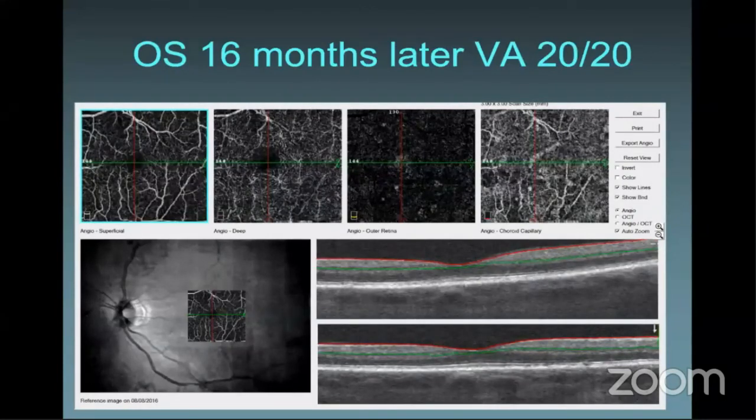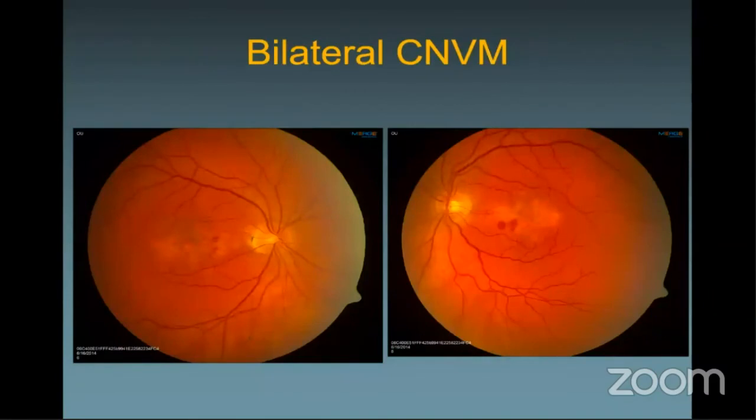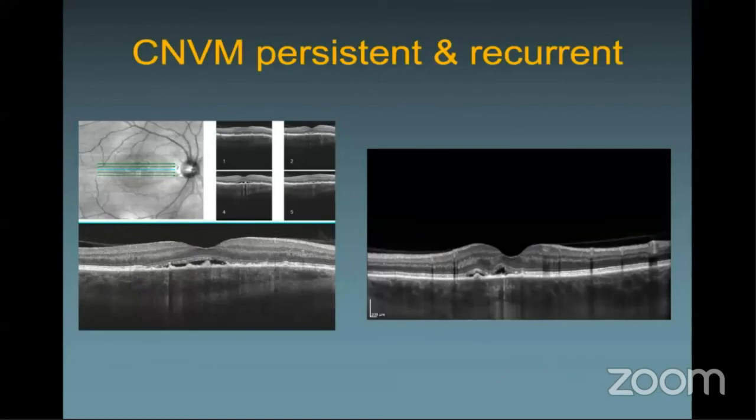following the initial treatment. However, unlike the previous example, this patient with persistent placoid maculopathy has bilateral lesions with bilateral CNVM as evidenced by subretinal hemorrhages, and can be seen on OCT with subretinal fluid, irregularity of the pigment epithelium, infiltration of the choriocapillaries, and the superficial choroid.